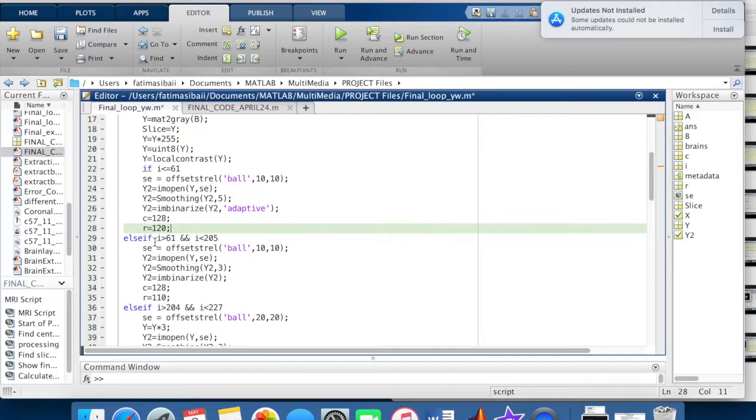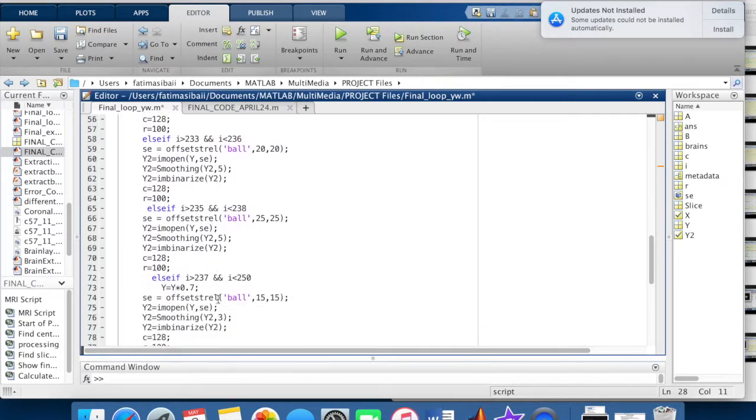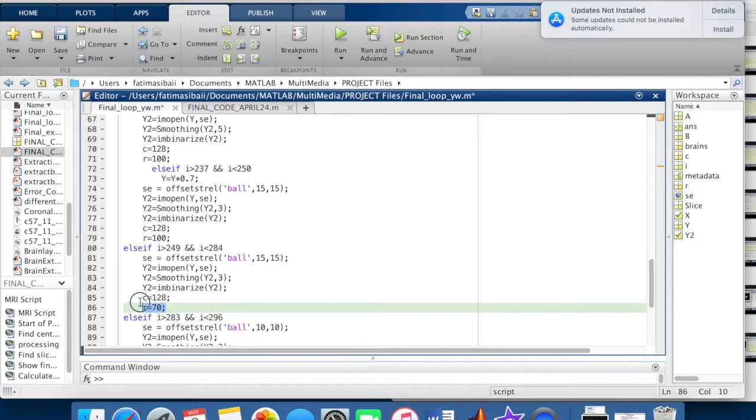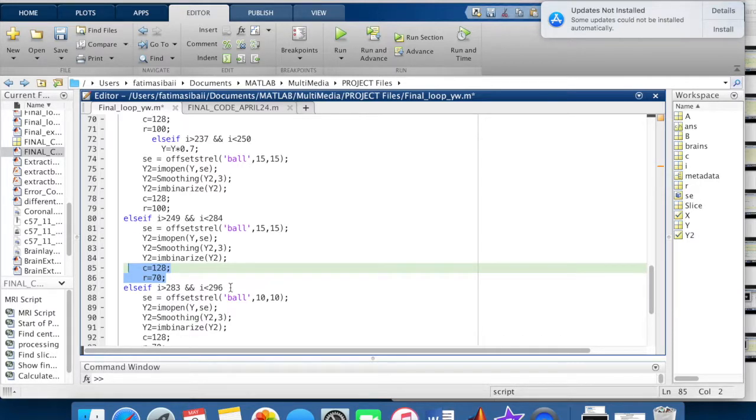And then, in order to select the object that represents the brain, we looked at where the brain is in most slices, and we chose a column and row number. This number also changes slightly between the if statement conditions because while the brain starts at the top, in the last few slices the brain is actually in the bottom.